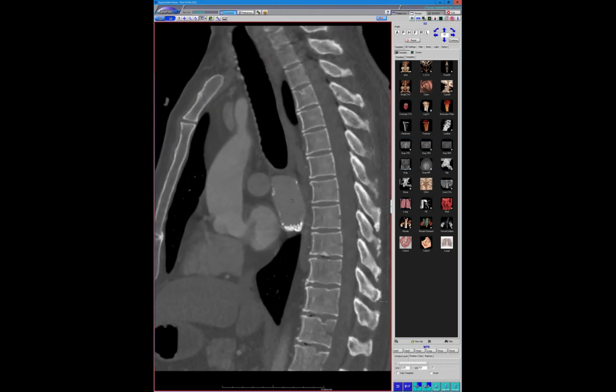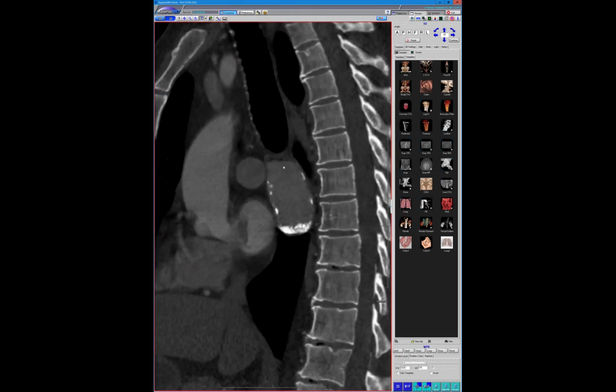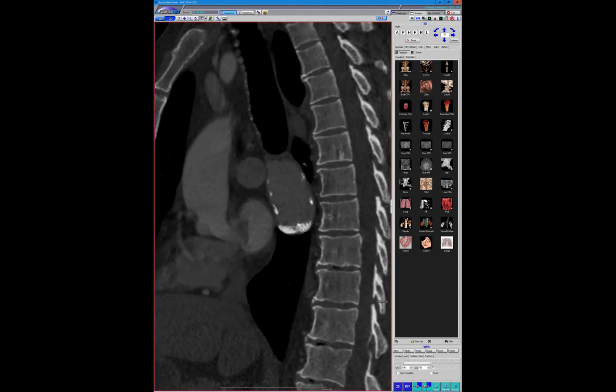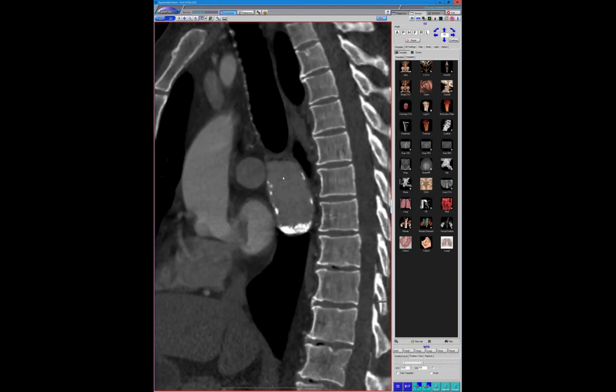But you're right, it does look like there's something. I can't tell if that's along the cyst or along the top portion. Anyways, maybe it is a hamartoma. I thought it was, I mean, not a hamartoma, a teratoma, but I really don't think so. It's got to be a bronchogenic cyst with layering milk of calcium. I guess it's possible.